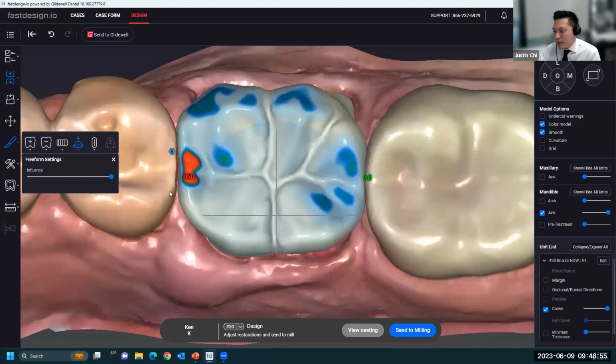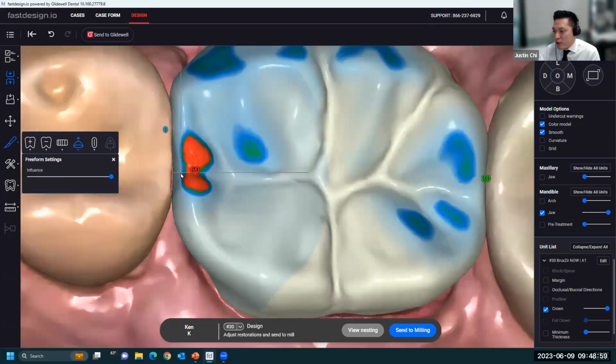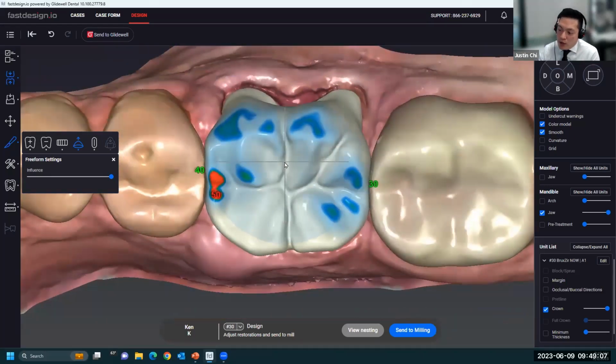Everyone has, I think, a preference for their design tooth. And so when I raise that mesial marginal ridge, I can see that that mesial side is kind of opening up. So I can close that contact there. All right, so from this occlusal view, once the broadness of our contacts are set, the chewing efficiency and occlusal stability, identifying that ideal cusp-fossa relationship, then from there, I'll check the axial contours and emergence profile.